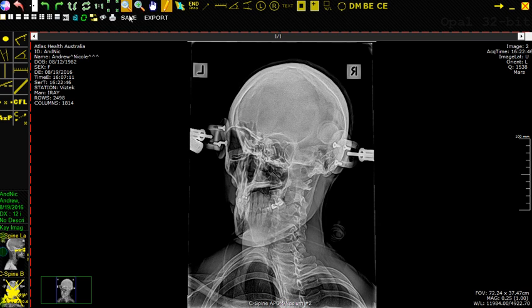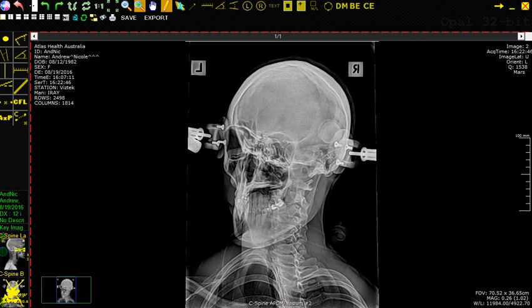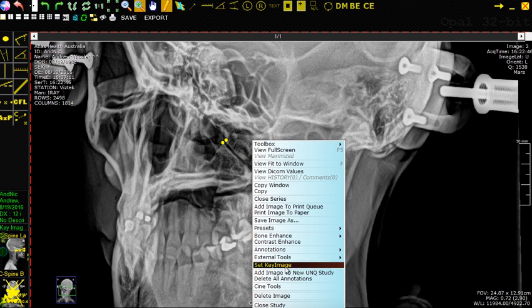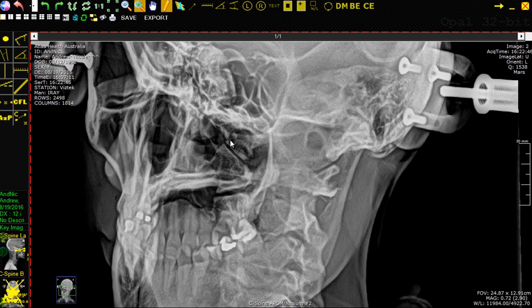I'm just going to zoom in so you can see the importance of it. When you take a person's own bone structure into account, you can see a very sharp and very clear joint right through here. And this spot should line up exactly with this spot. Right here's another case where the two dots are a little bit larger than we would ideally like, but still that works.